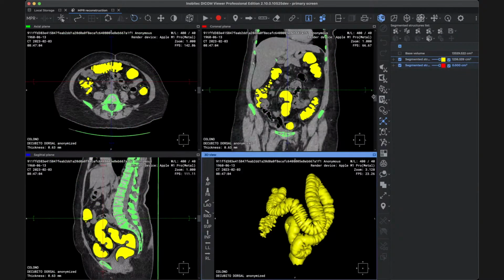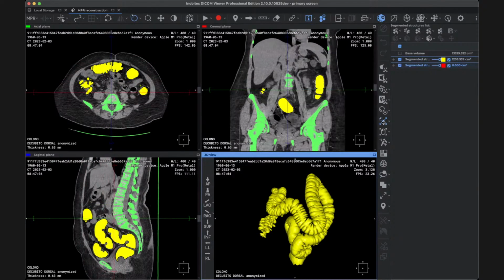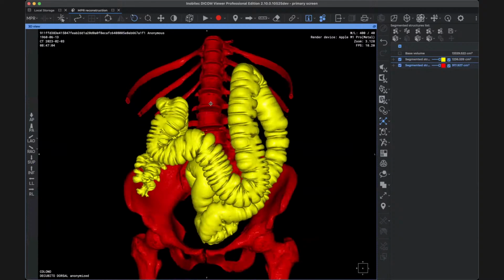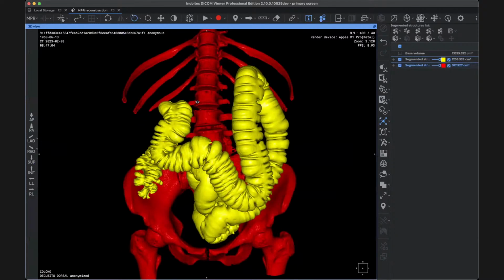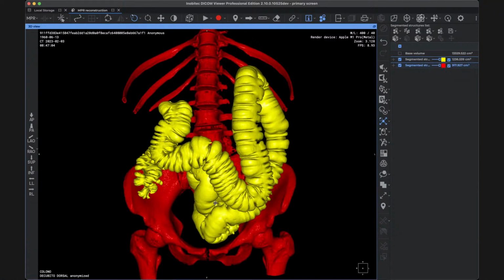Okay. Check if the bone structures are marked. Use this tool, the segmentation from point to mask, click on it, and it's done. We have now the bone structures and the column, and you can see the relationship of the bone with the pelvic structures, the pelvic bone structures. Very easy, very fast, few clicks. I think this can speed up the process of the segmentation professional.